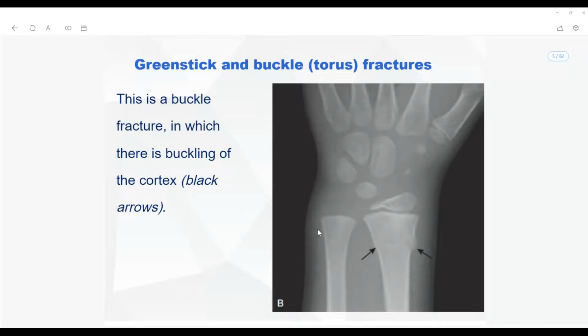Does everybody know what the carpal bones are here? The age classification on the bones is generally done according to the number of carpals that have been ossified.